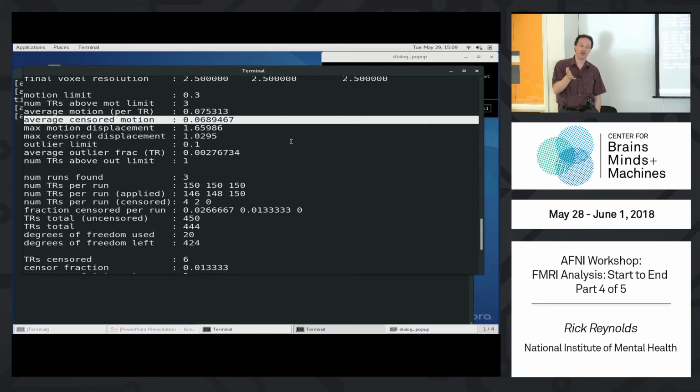We also have a program called @radial_correlate that you can ask afni_proc.py to run, or you can run it yourself. At every voxel, it takes a 30 millimeter spherical average over time, and it correlates with that. Basically, the results should show correlations in small anatomically relevant areas.